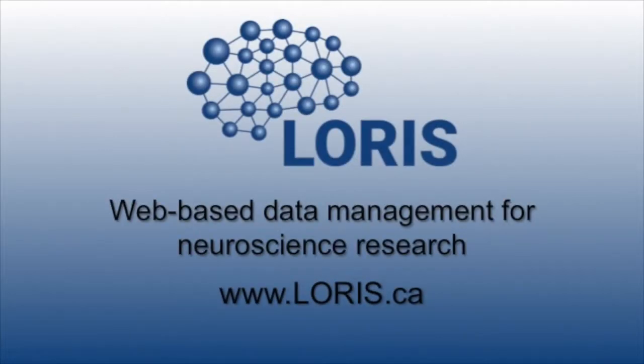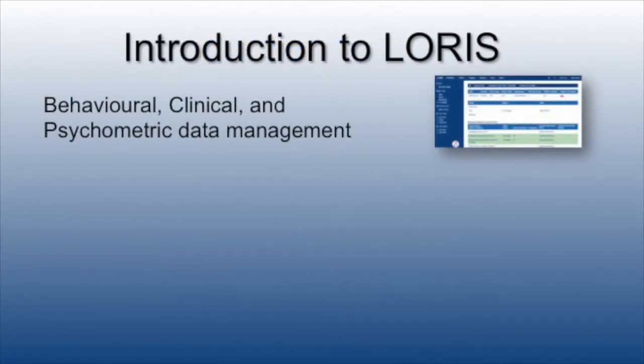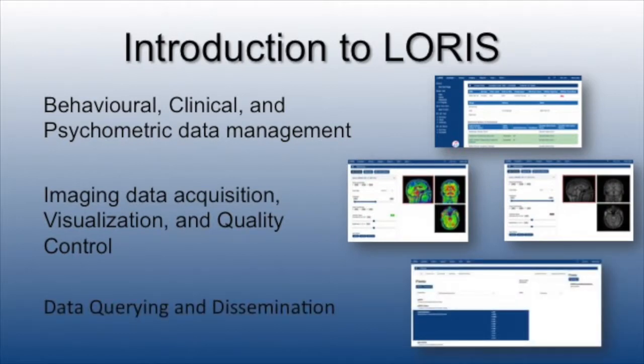Welcome to LORIS, a web-based neuroimaging data management platform. This video presents a basic introduction to LORIS covering the behavioral components, followed by the imaging side including visualization and quality control, and finally delving into data querying and data dissemination.